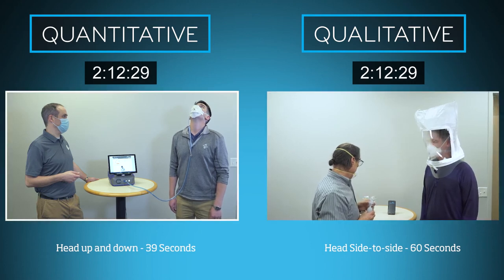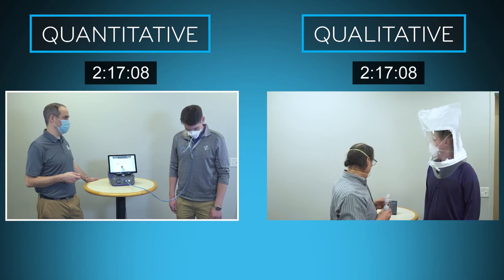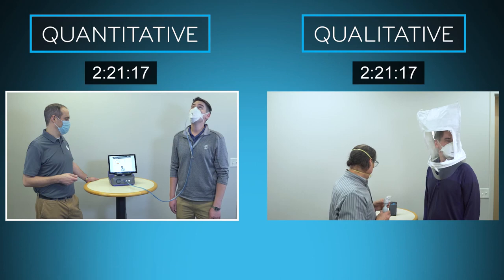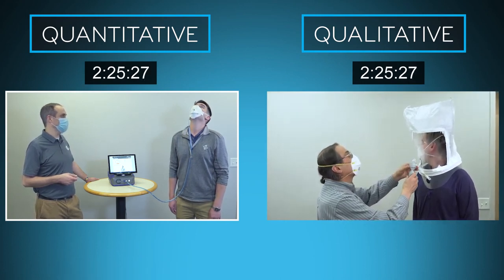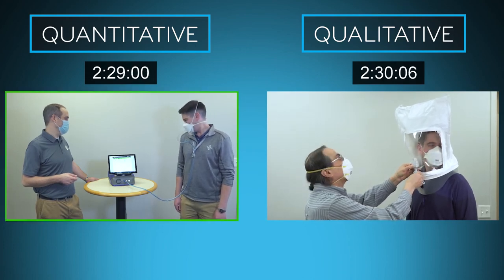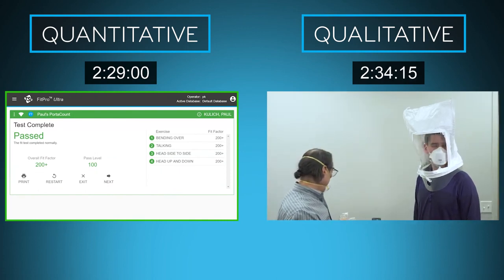The PortaCount fit tester reduces the fit test down to just 4 exercises and a total test time that is nearly 65% shorter than the qualitative fit test protocol. After just 2 minutes and 29 seconds, the quantitative fit test is complete. The screen displays the results for each exercise, the final fit factor, and the result of a past fit test.